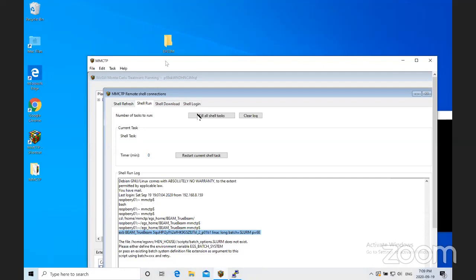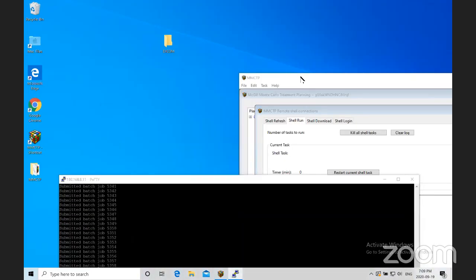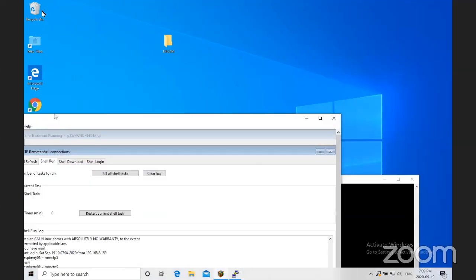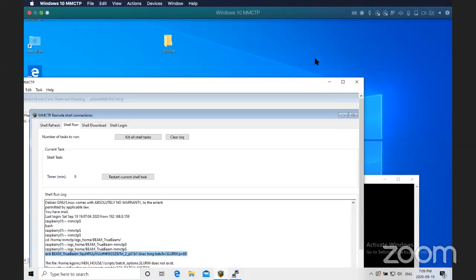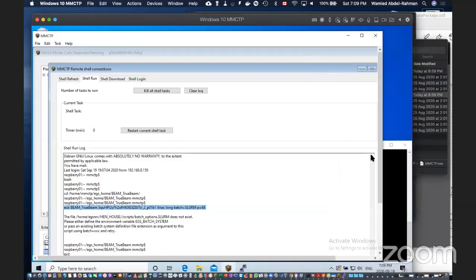I think I've copied a compiled version. Let me check it. I need to copy this folder.